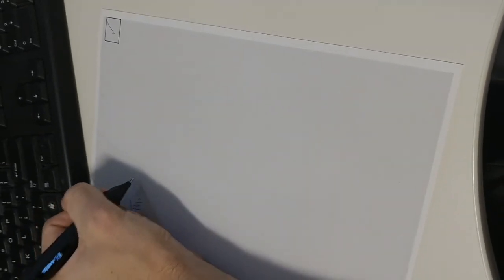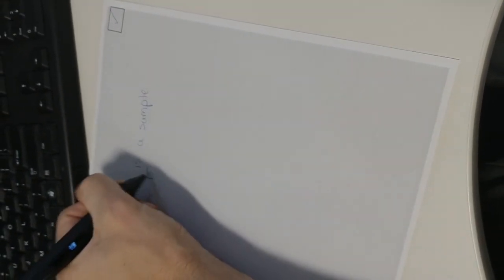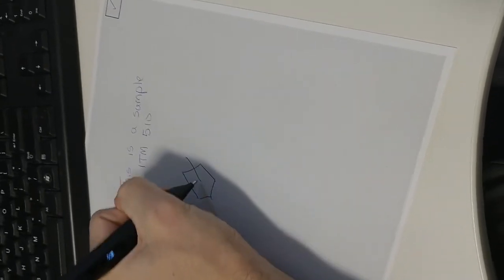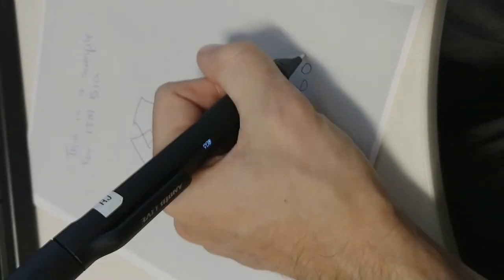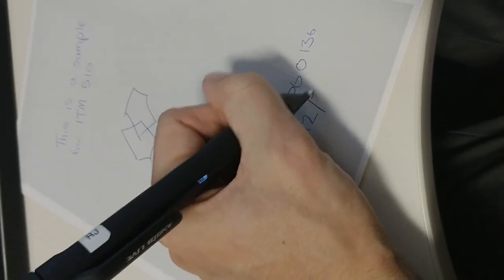And now here is the video of the digital pen data acquisition. I use a special optical pen that has a camera near the tip that can view a paper with a special dot pattern, and it can actually know the coordinates where writing has happened on the piece of paper. It looks just like a regular piece of paper with a little gray tint. We use this paper and special optical pen for the acquisition of MMSE data, that is the cognitive test data, at the Rush Alzheimer's Disease Center.